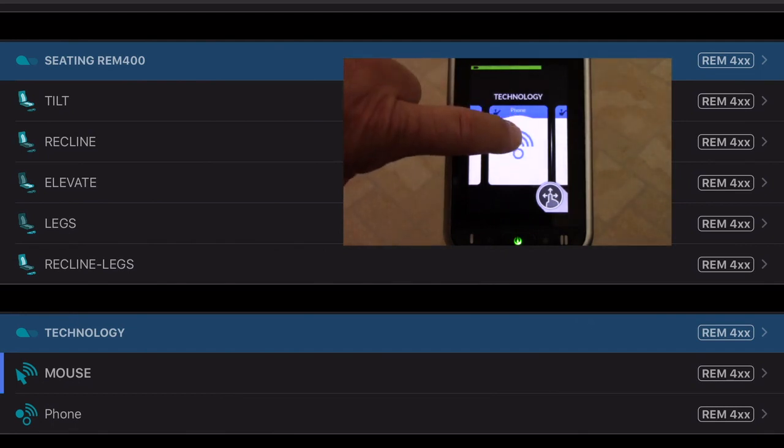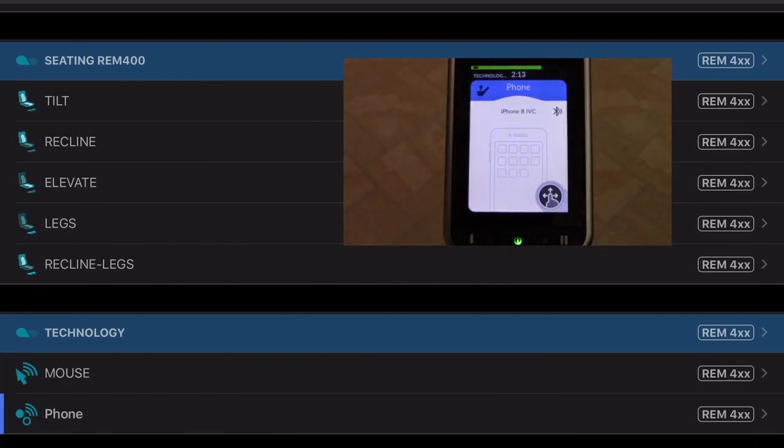If I swipe, there's my phone. So those cards are connected there. If you need the phone up in the driving profile because your patient wants the phone up there, you know how to move it. If you need it in both places, you can duplicate it and put it up there. You can put it in every profile, doesn't matter. You can move them around and customize these to be exactly what your patient would like.